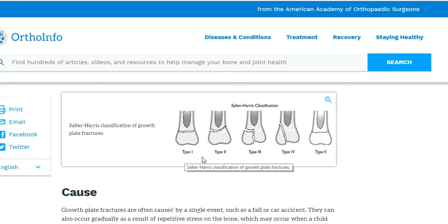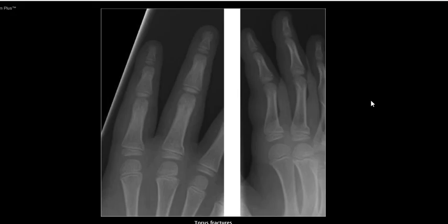However, the severity of the injury does increase as well. And if we are talking pediatric imaging, we're talking also about any buckle fractures, or what are commonly referred to as torus fractures, buckling and bulging of the cortex.